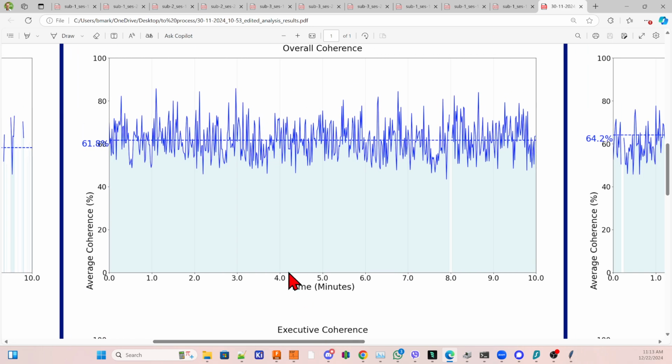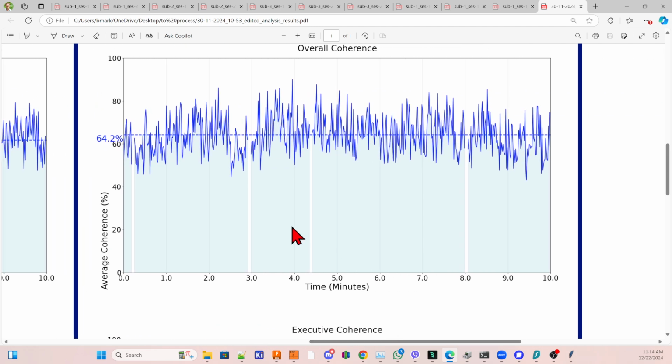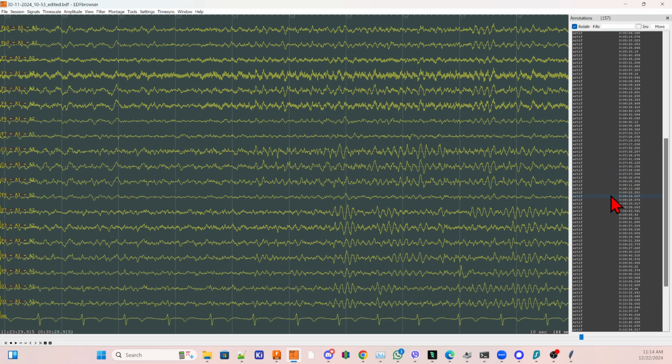And here in the eyes closed period there was 1, so we can see that here, and it was not an eye blink but some kind of muscle twitching. And during the TM period there were 3 or 4, you can see 4 periods here, and then during the rest period there was 1. And we can see that matches here. During the eyes open there were a whole bunch of them.